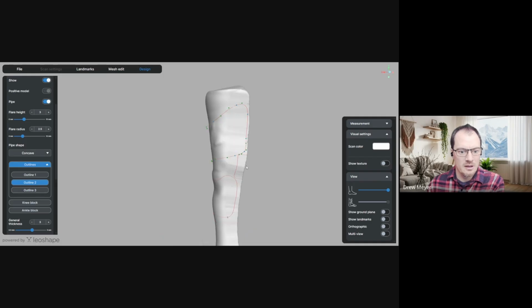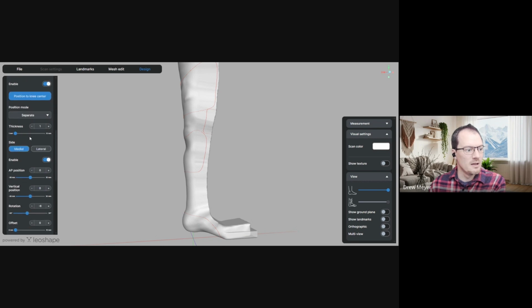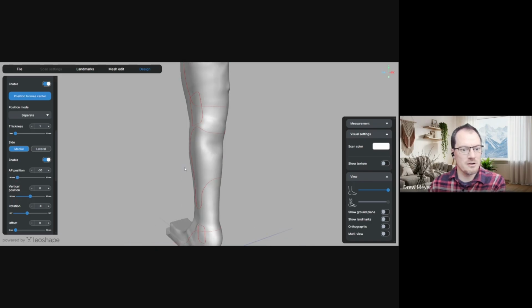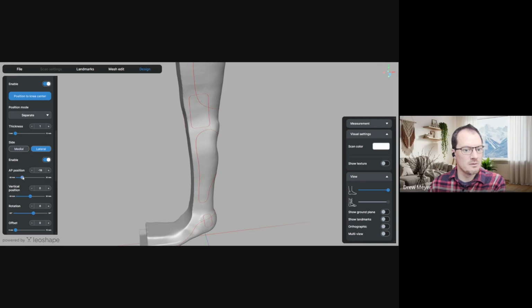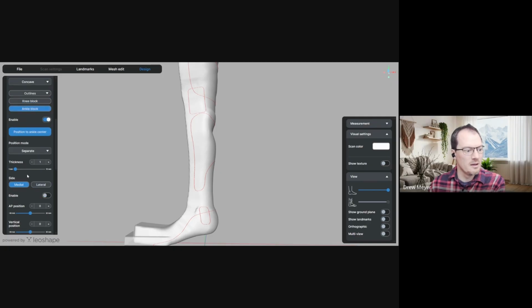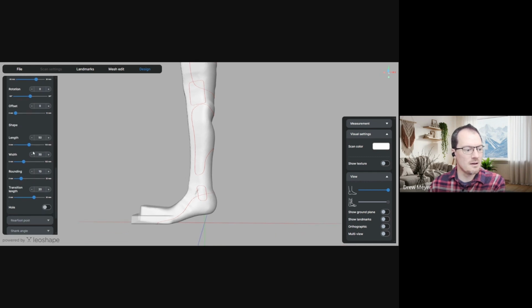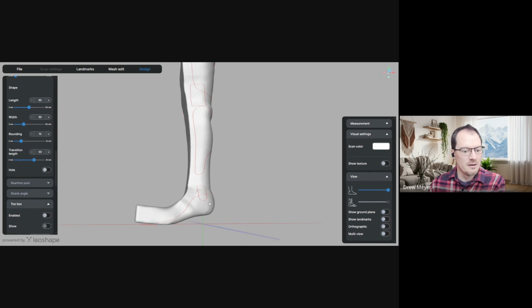Okay, so if I add in this template, we have these knee block tools now, and these knee block tools are something where you can position these structures here. So with this lateral, I can position these blocks similar to my joint positioning, and then there's also one for the ankle block. And so I can set the position and the height of these where my joints are going to be, and I can control my trim lines.